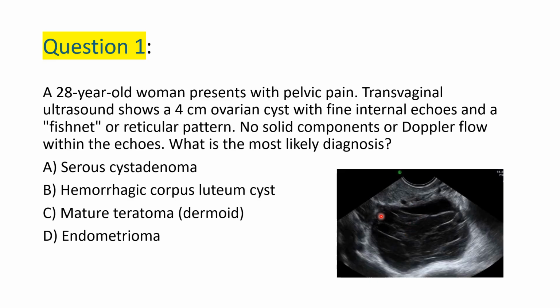So this is in keeping with a hemorrhagic corpus luteum cyst because blood confers the fishnet appearance that we are seeing there. So this is not a serous cystadenoma.